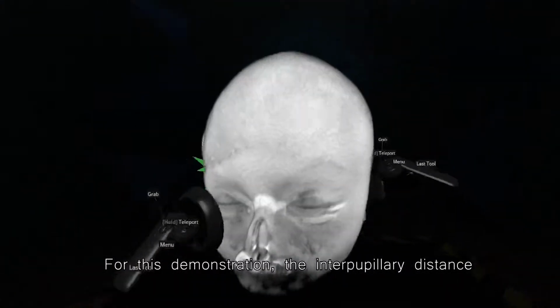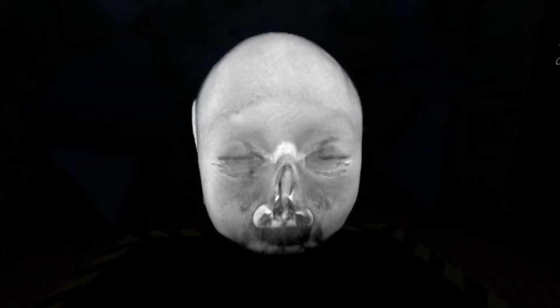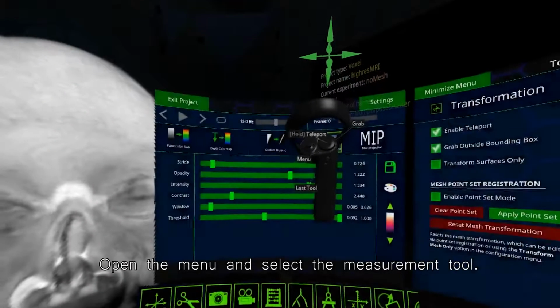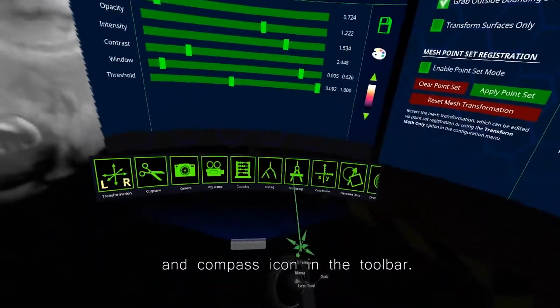For this demonstration, the interpupillary distance is measured in an MRI scan. Open the menu and select the measurement tool. It's represented by the ruler and compass icon in the toolbar.